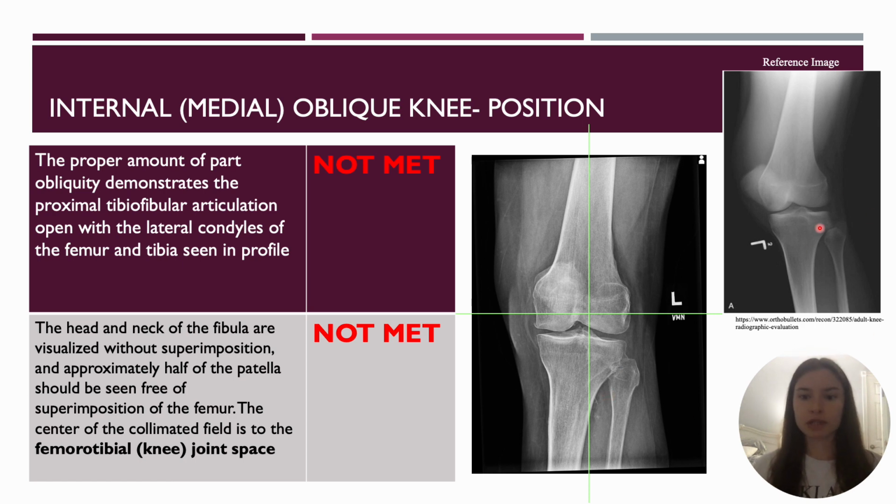If you look at the reference image right here, you can see that there's less superimposition and that articulation is very open. In comparison to this image, it's less open, which means we could have obliqued the patient a little bit more to open up this articulation right here.